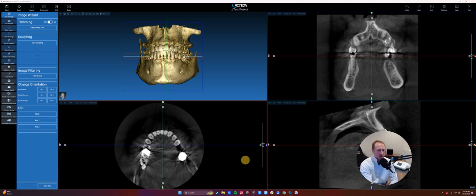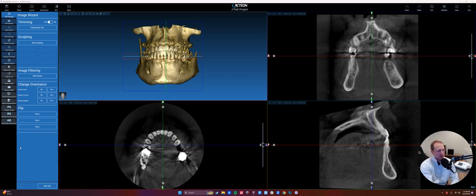And there's a couple ways to handle these panels. Most of the time we can just hit next step. And so we can treat this almost like a wizard that's going to take us step by step on how to read the image. Personally, I like to take an initial glance at the CT at this phase before I go into importing data, drawing the CPR curve, and so on. So I'll show you quickly how I do that.